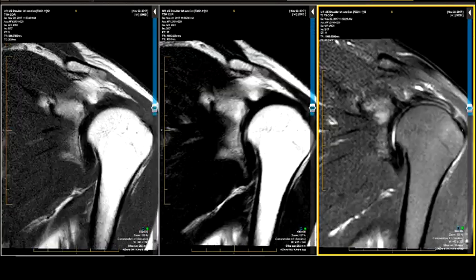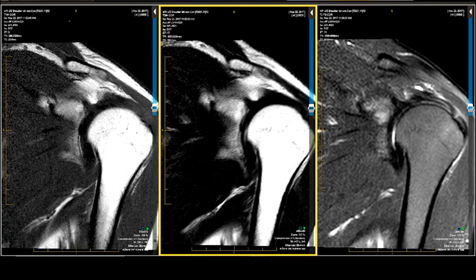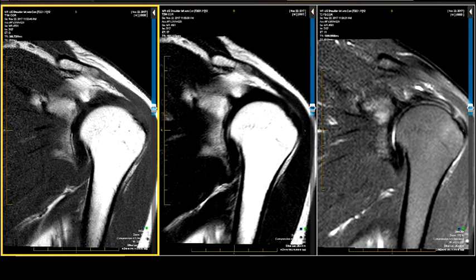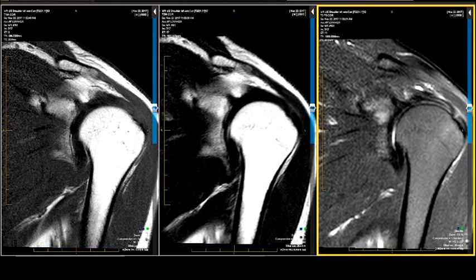And let's scroll. I'm going to move mine over a little bit so you can see it. How are we going to describe this thing?